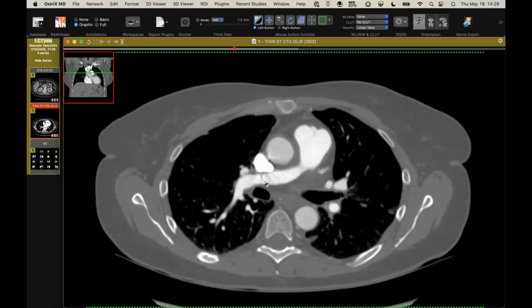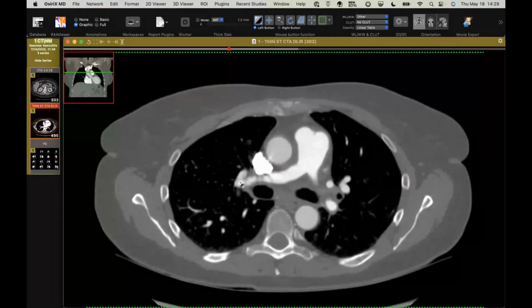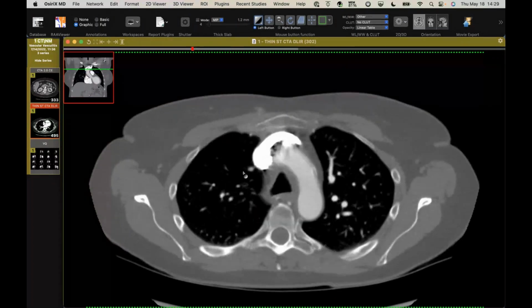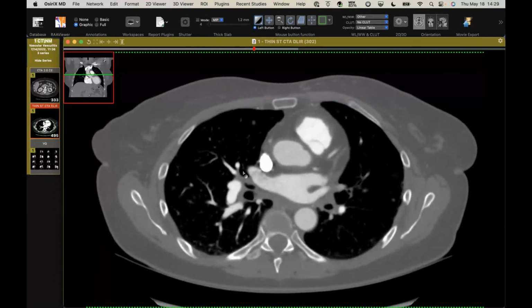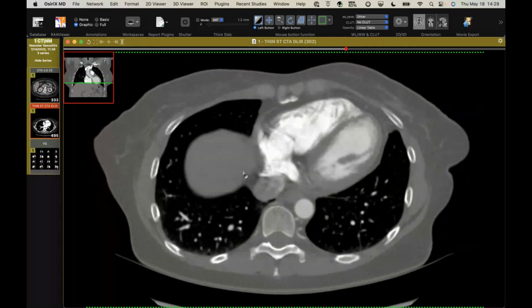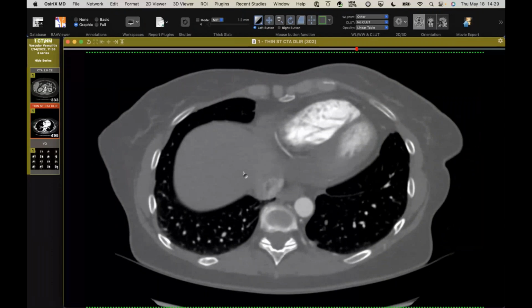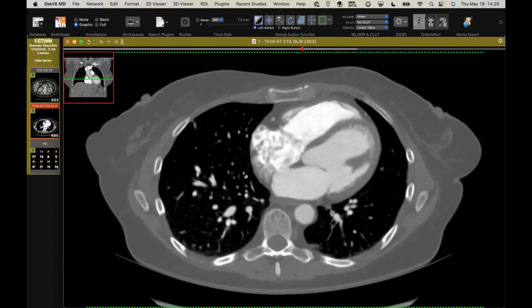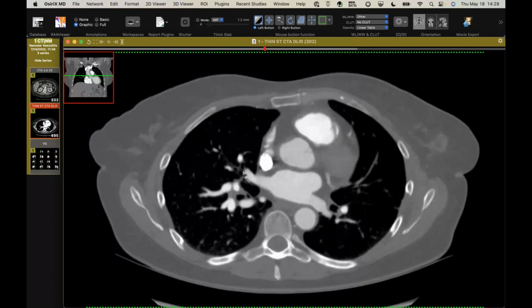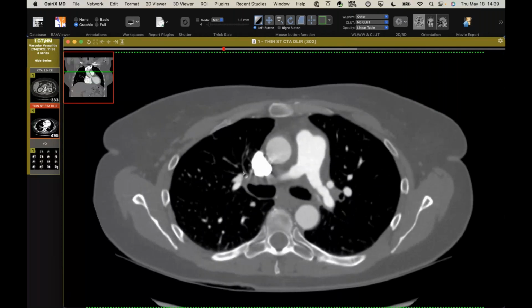And that right upper lobe pulmonary artery is still very small. There's a posterior branch coming up. The anterior apical branch is patent, but that anterior branch, which should be right here, is out. So Takayasu arteritis affecting the pulmonary arteries and the systemic large arteries in a slightly older patient. We saw some improvement, but some of this is more chronic. But if you just had this scan, you could potentially end up calling this incorrectly chronic PE with some occlusions. And of course, the treatment would be very different.